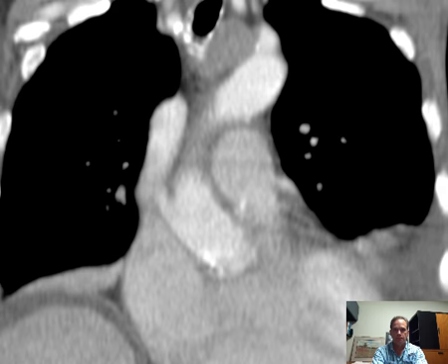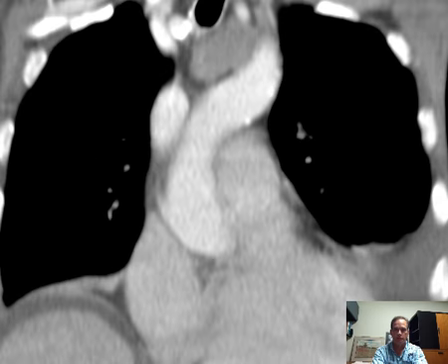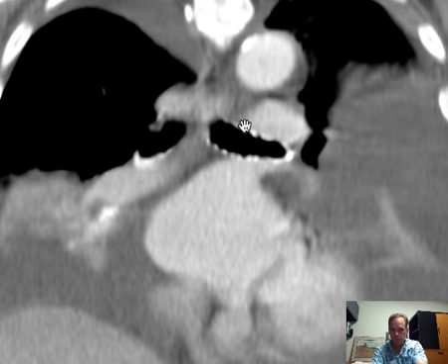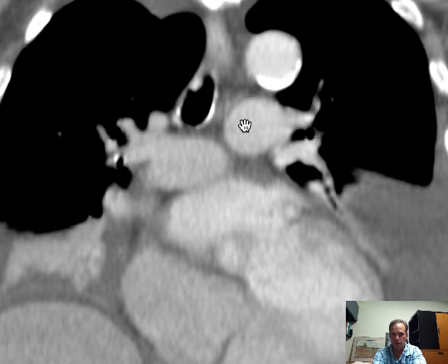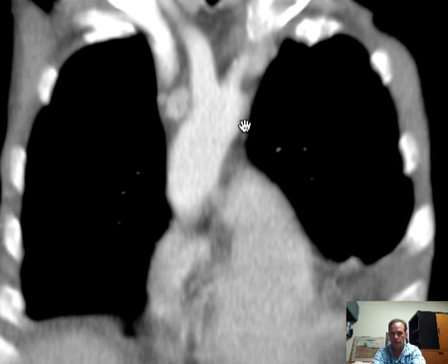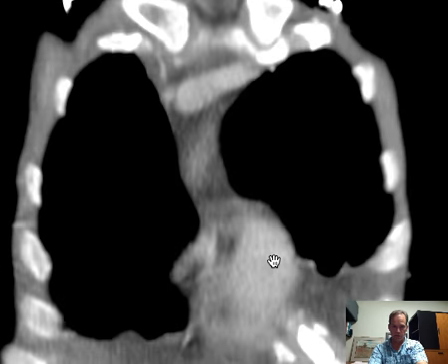All right, here we go. Now this will show you nicely how that embryology is obtained from one vessel here that is divided by a septation, and that septation divides in this manner, like one of those circular stairs, and that's why the aorta, which starts out posterior to the main pulmonary artery, ends up superior and somewhat anterior to it, because the main pulmonary artery, here we are, we've gone anterior.